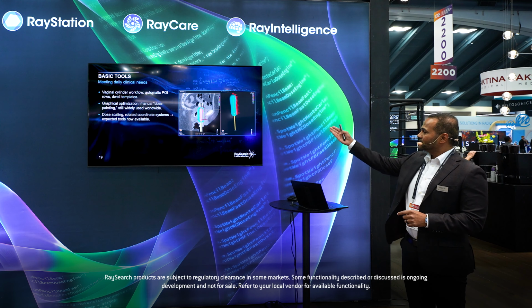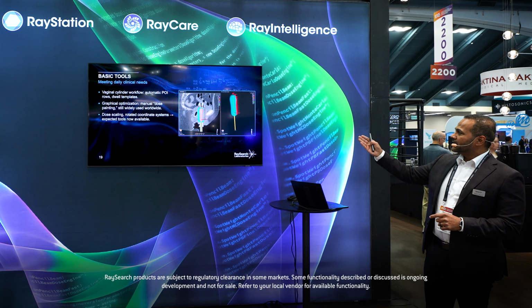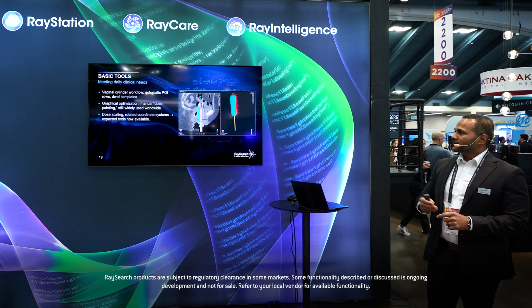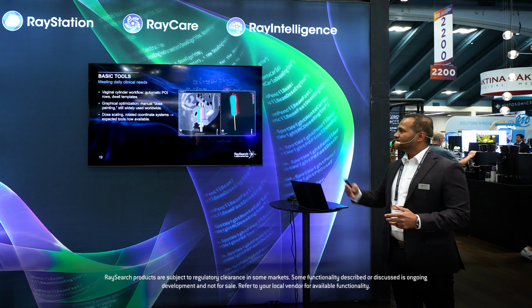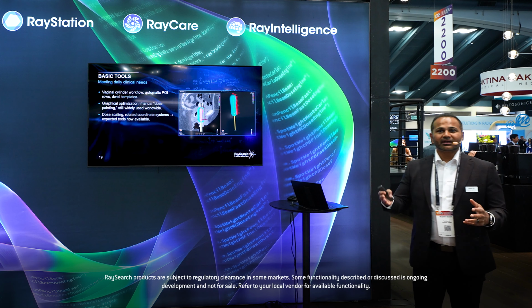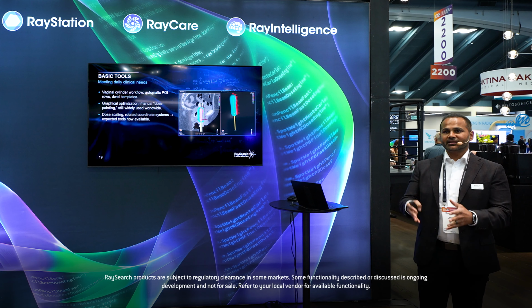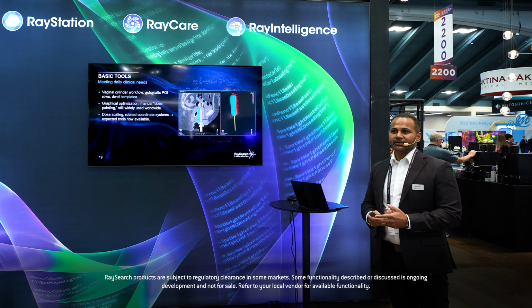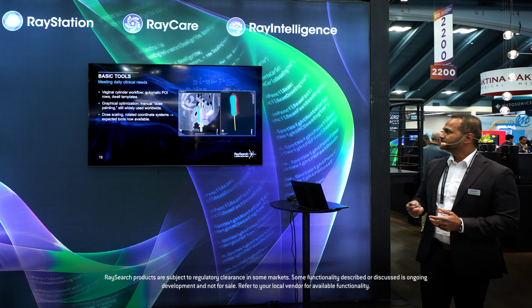We have that ability, so you can see on the screenshot here of a cylinder case where all the points are placed. We also give you the ability to dose scale and rotate coordinate systems, expected tools that are available so you can do the basic standard processes. You're not going to lose any of that functionality by going into RayBrachy.